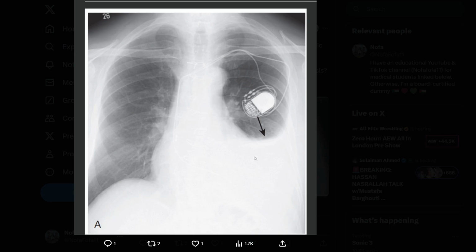On top of that, there's the presence of a moderate-sized left-sided pleural effusion. You can always tell this is a pleural effusion because of obliteration of the left lateral costophrenic angle. Compare the left lateral to the right lateral. There's obliteration of the left lateral costophrenic angle, and therefore there's accumulation of fluid. This fluid can accumulate to give a meniscoid, U-shaped appearance.